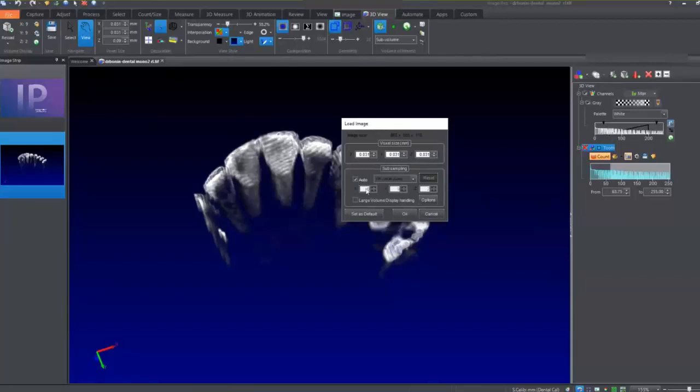So what I would do is, you can see these values, the 9 and the 2. If I turn this off, let's just turn auto off and reset my values, now it's going to be 111. And what that means is, we'll give it a second to recalculate here. Then the image will come back and be rendered at full resolution, okay?